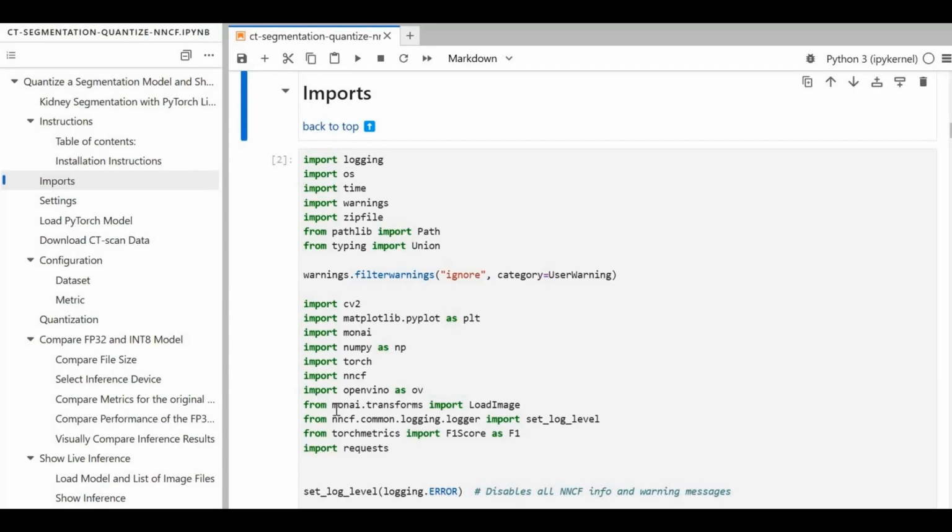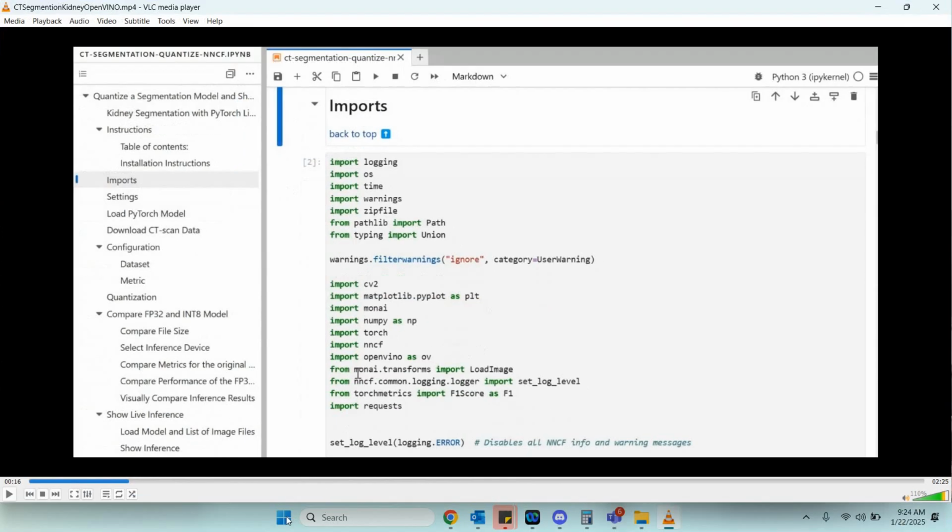The notebook is very simple to understand and it is structured in a very simple way. We will go ahead with the setup and environment related things first. Then we will go ahead and load the model. Quantization will follow. Then we can do the inference and visualization. And finally, we can have the demonstration run for you. I'm going to walk you through that right now and I'm sure you will like it.